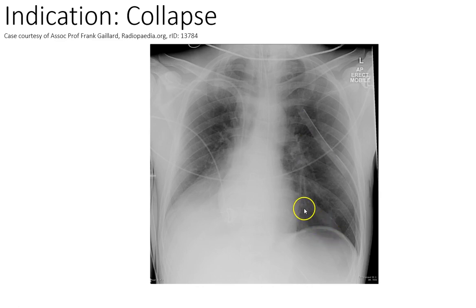Still, there is some slightly interesting texture to these lung markings. It's a little bit gritty, which sometimes you might call ground glass. So I'd be keeping an eye out for that. That occurs sometimes if somebody's got a fibrosing alveolitis, something like that type of picture, or sometimes it comes with things like ARDS. It's this gritty texture to it. Up here it's more fluffy, whereas this looks a bit gritty, but at the same time that doesn't really fit with the rest of the film.